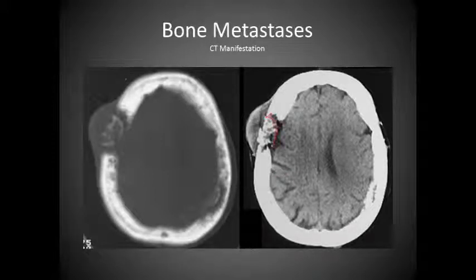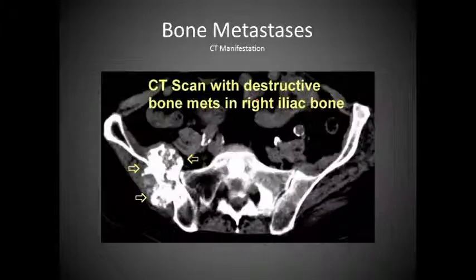Here's another form of bone met. We see bony erosion here, with this being possibly the only amount of bone left. We also see an area here as well. We have an abnormal growth here, and we do see atrophy in here due to the pressure that is being put on the brain.